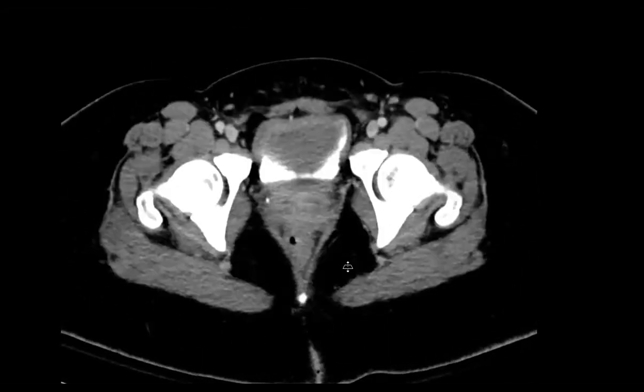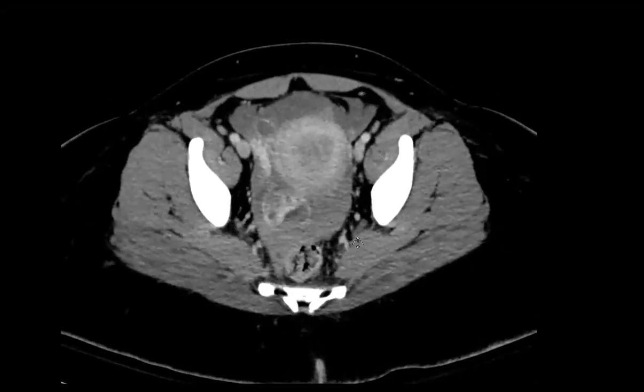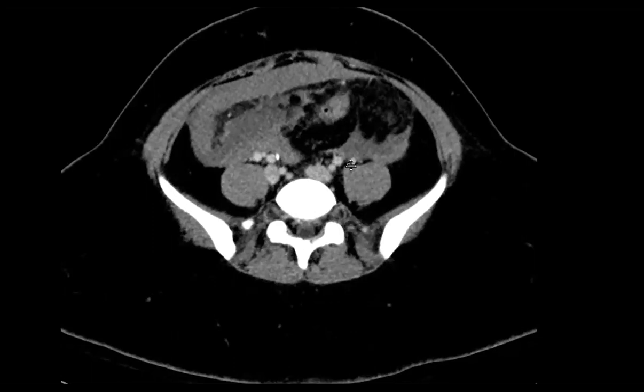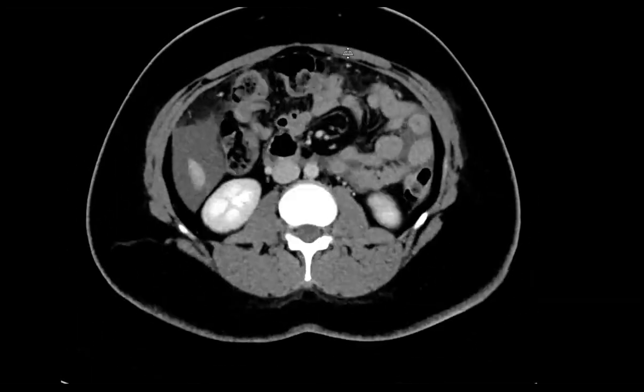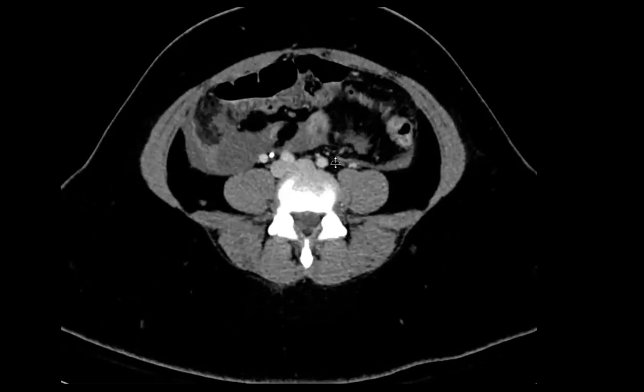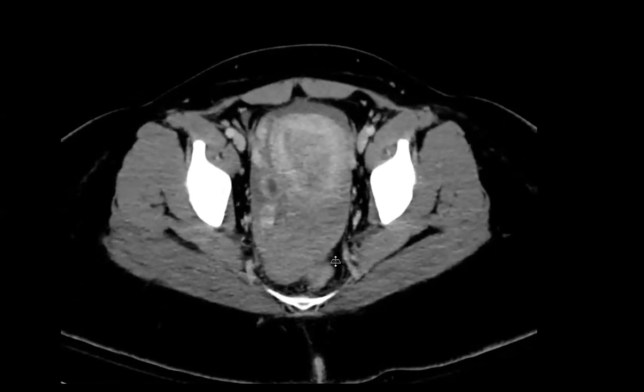And I assume she got a pelvic ultrasound first, right? Because probably her HCG. Well, she was transferred from an outside hospital, so I would assume the ultrasound was done outside, but we never got an ultrasound here. They were concerned for bowel ischemia or other things. That's why they got the CT. Got it. Because if her HCG was up, usually they don't start with a CT. With a CT, yeah, good point. So I'm not sure why they just started with the CT. She was transferred, so there are some missing pieces of the history. Yeah, that's a lot of active extravasation.